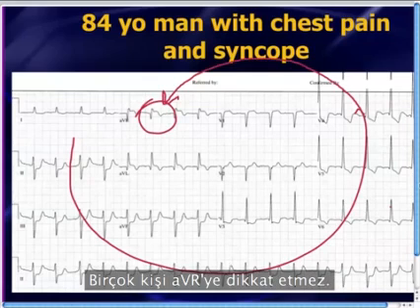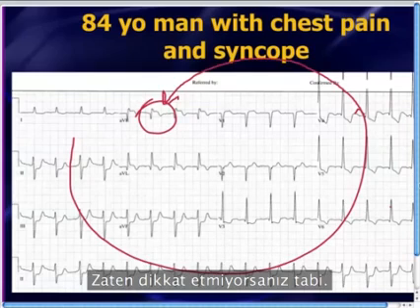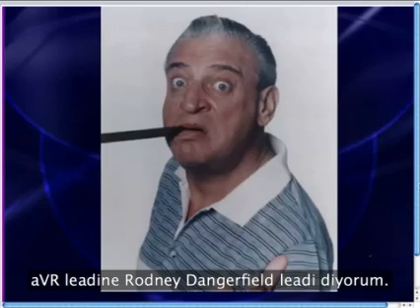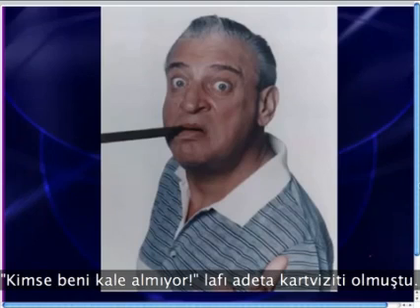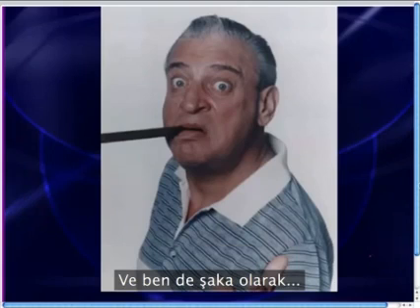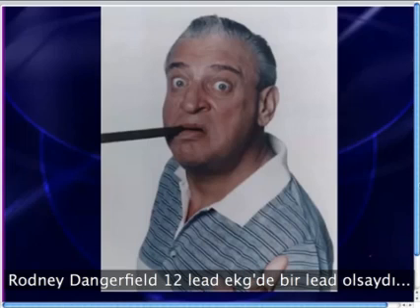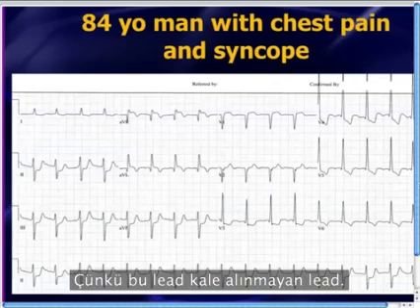Now, a lot of people don't pay attention to lead aVR, and I hope after watching this you will, if you haven't already. I like referring to lead aVR as the Rodney Dangerfield lead. Many of you remember the famous comedian Rodney Dangerfield, whose calling card was always, "I get no respect." His entire act was based on the concept that he would get no respect. And I jokingly will refer to, as an analogy, if Rodney Dangerfield were a lead on the 12-lead EKG, he would be, of course, lead aVR, because it's the lead that gets no respect.